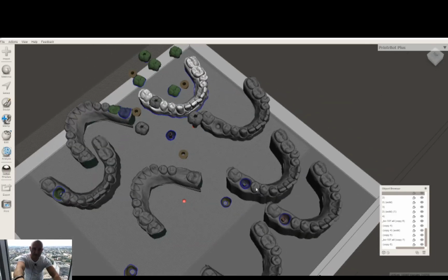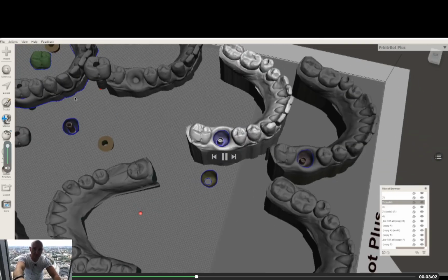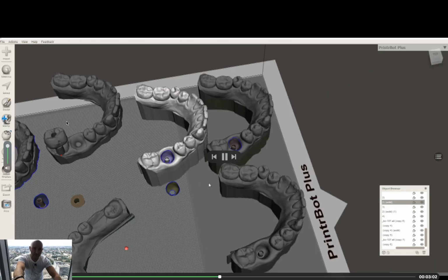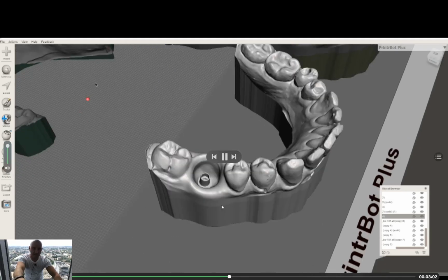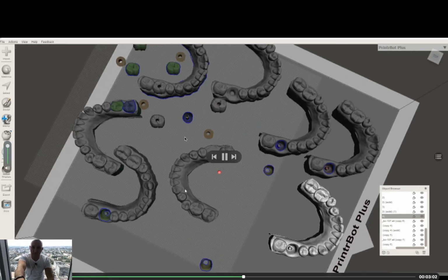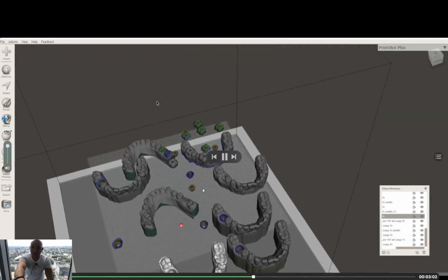On this I designed also here by choosing with these elements a custom healing abutment adjusted to my T-base here. On this I designed implant screw retained crown, for design of which I used shape of tooth number 47.